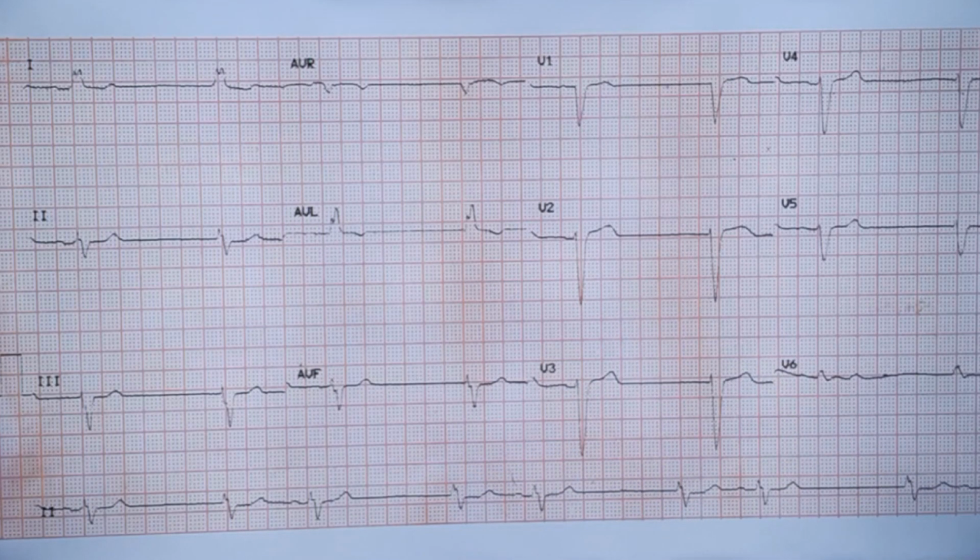So this ECG is a complex ECG which shows conduction, or rather pan-conduction system disease. You have sinus bradycardia and junctional escape. And even the junctional escape is delayed because the interval here is quite long: 1, 2, 3, 4, 5, 6, 7 divisions. In a junctional escape, you expect a rate of around 60 per minute.